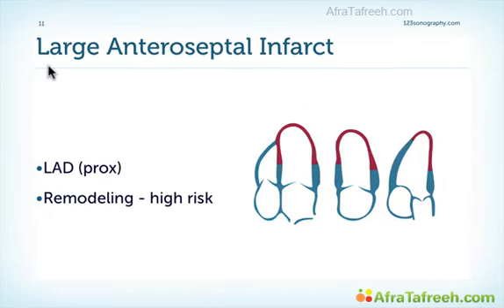Then we have the large anteroseptal infarct, which is even larger. It is caused by an LAD occlusion which lies very proximal before the first septal branch. The risk of remodeling is very high in these patients. You almost always see some form of remodeling.